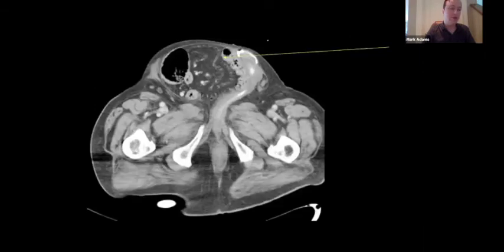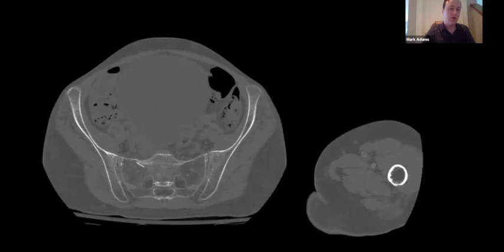Conversely, this patient has bowel in his scrotum, fatty atrophy about the bilateral gluteus maximus, and the redundant pliable skin common in malnourished patients. This patient has a right sacral fracture, and it is associated with significant osteopenia in the bilateral sacral ala. Furthermore, there are calcifications in her arteries. Believe it or not, this patient is a 25-year-old, but she is diabetic. And based on what we see here, physiologically, she would be comparable to a geriatric patient.